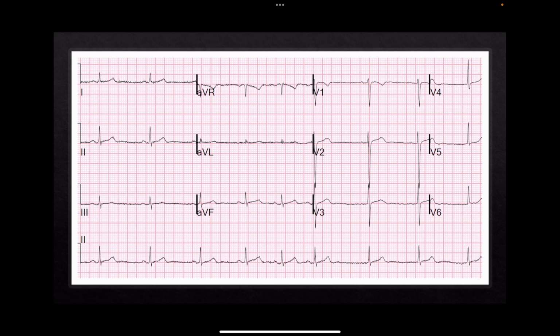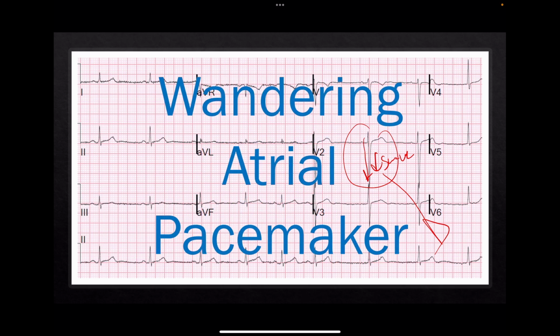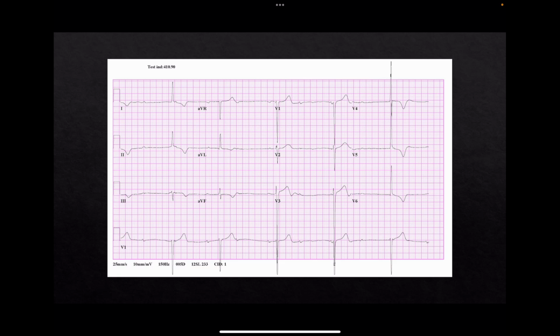Okay, what's going on here? Why do you see left ventricular hypertrophy? And what is special about V2? That deep S wave, which is going to be the opposite for the left side of the heart. So yes, this is left ventricular hypertrophy, or a wandering atrial pacemaker in this one with left ventricular hypertrophy. But look at the P waves, guys, especially the bottom one. And then you have a pause here. No P wave there, no P wave there, no P wave there. That's why you have to do rate, rhythm, look at all the P waves, look at the QRSs and so forth. Keep looking.